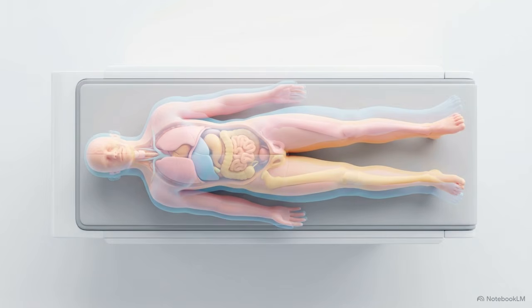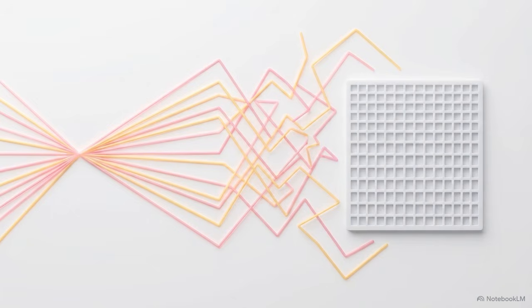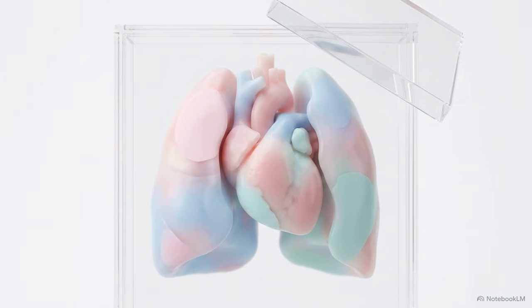If the patient moves during the acquisition phase, the physical source of the photons shifts relative to the camera, misaligning the trajectories over the duration of the scan. Before a single piece of hardware registers a hit, tissue attenuation and patient motion can blur the structure and create false negative absences of signal.